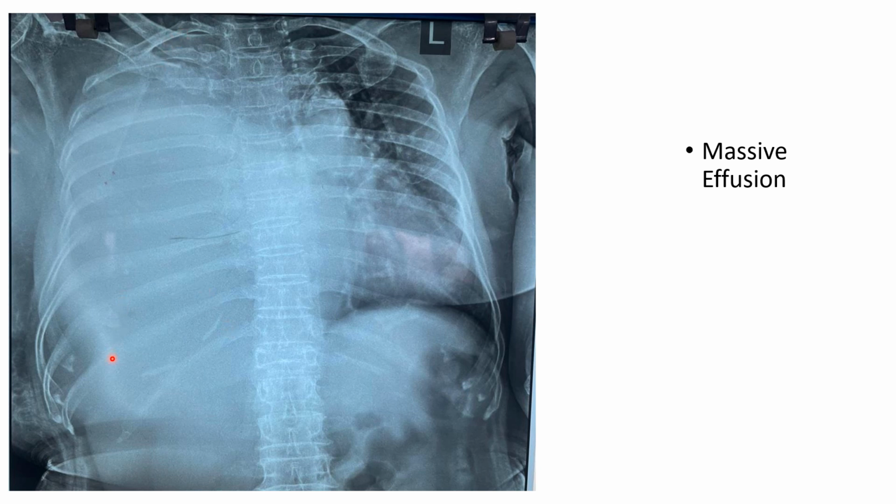Now the right side, whiteout, looking very clean, right? No air bronchogram, no patchy consolidations, full white, clear whiteout. And then you see the trachea, it is shifted somewhere here, right? And the mediastinum, this cardiac shadow, is shifted. If you see the rib spaces, there is a subtle increase in rib spaces compared to this side, right?